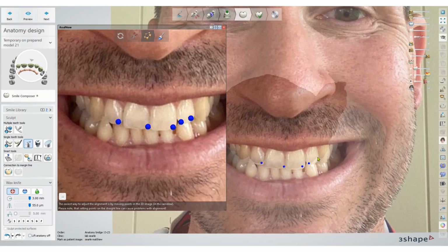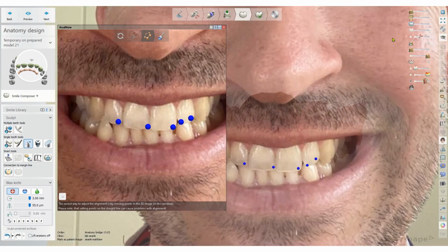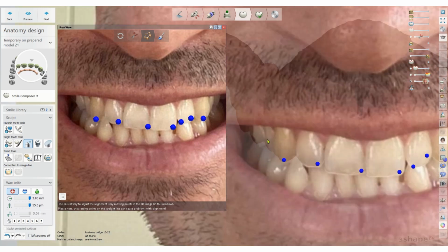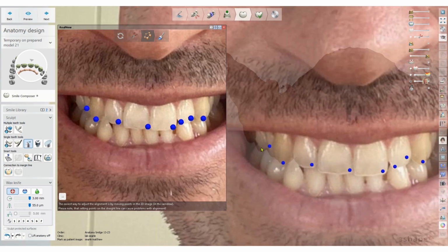And now I'm going to click there, and I can see that it's there. So you can see how the scan's in the background image. You can start to see where that is. See that shadow down there? So I'm going to click on there, and then I'm going to click on there. And now every time that I do this, I'm going to click there, and then click on there. So it keeps on refining, and it will keep on adjusting until I've got it pretty close to where I need it to be.